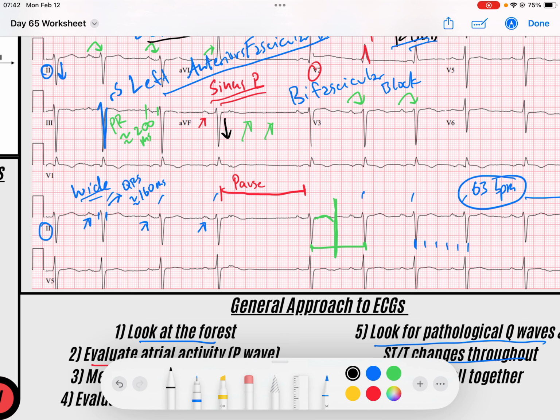And so what I want to look for is, I've got this P wave that conducts to QRS, P wave that conducts to QRS, and then I look for another P wave. If my P wave occurred here, and my next P wave occurred here, it should occur right around here, but there's no P wave. I don't see any P wave. It's just flat. And so I'm going to say, well, did something happen too early that maybe didn't conduct?